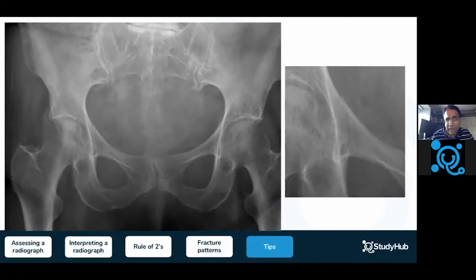So you then start looking for what is causing the pain for this patient. Is it truly a fracture? Maybe it's a flare-up of arthritis. Now, have a look first on the left-hand side. So if I trace the margin of the bone over here, that's pretty smooth and there's no sharp corners or turns or anything.